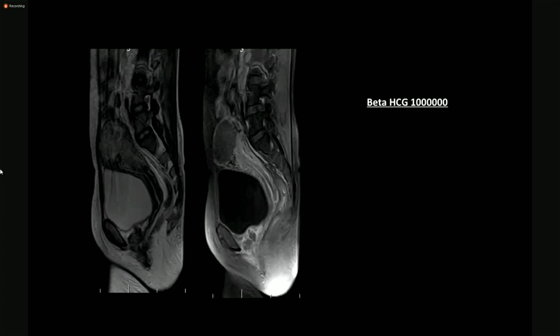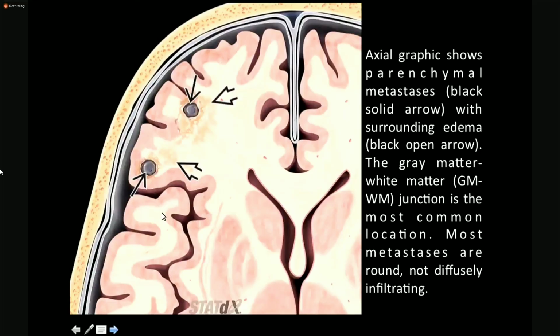So patient was a case of choriocarcinoma, young patient थी और उसके ब्रेन में multiple mets थे, ठीक है. ग्रे व्हाइट मैटर जंक्शन पे you are right, डिफ्यूज एक्सोनल इंजरी होती है, लेकिन आपको साथ में mets भी सोचने चाहिए ना. और ये टिपिकल इनकी यही लोकेशन थी जो मैंने आपको दिखाई है.